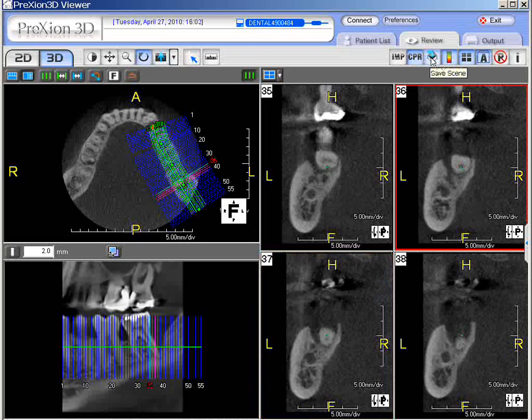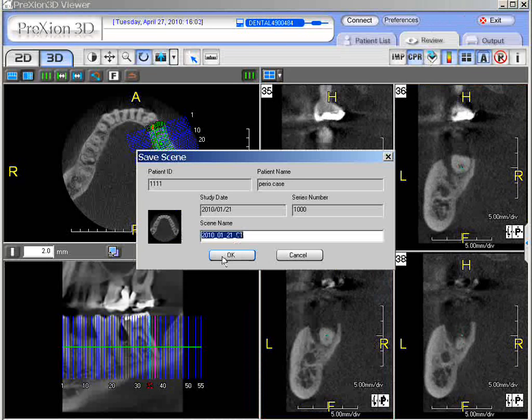and just type over. So you may delete or just start typing over whatever you wish to say. So I'm just going to say perio defect. Let's give it number 18 later. And then what you do is make sure you have all of the characters filled. You can't use the space bar.